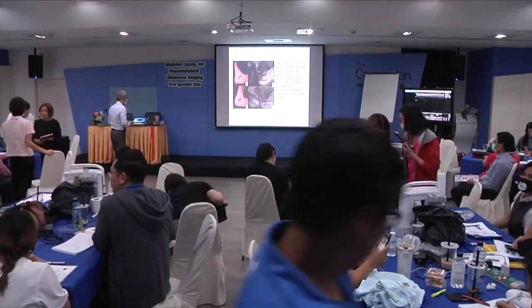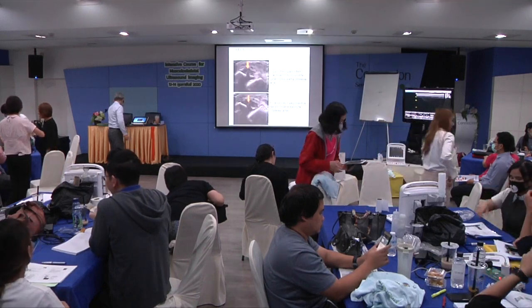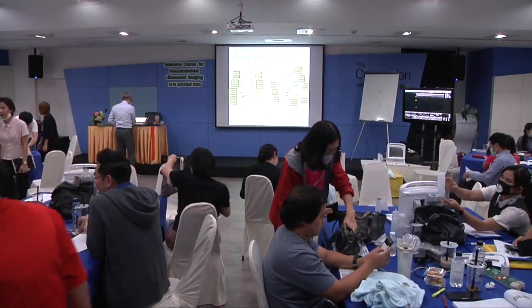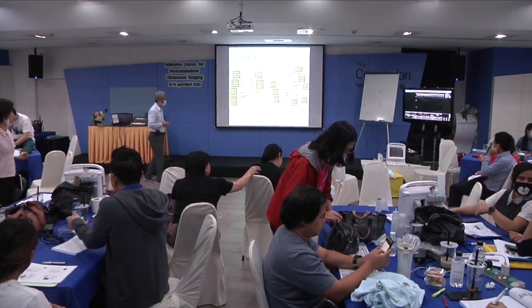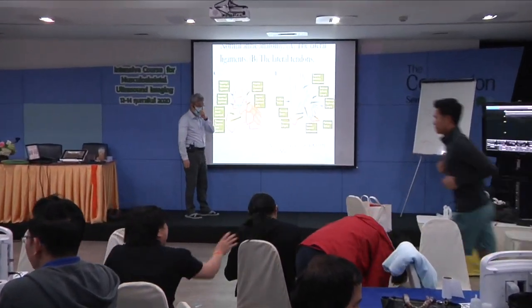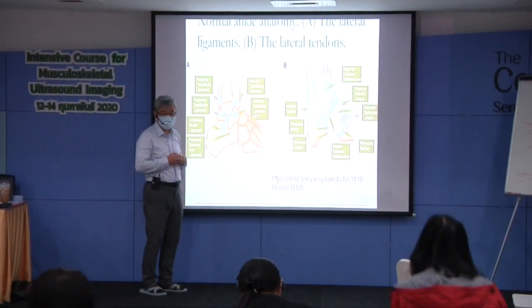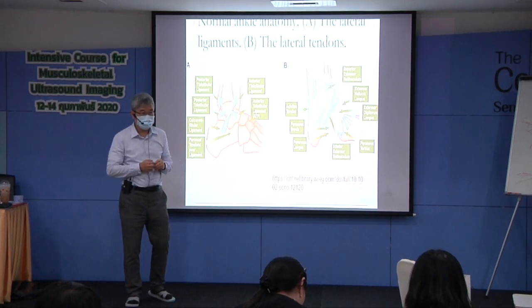Okay. We understand the importance of the structures, and we can use the imaging to evaluate the morphology of the ligament.